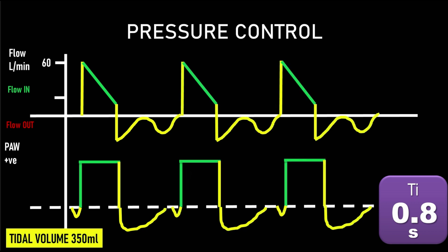What you notice is wrong with this picture. There are two things wrong with this picture. The first thing is you can see that there is a W-shaped expiratory flow curve. Normally that just goes up like a V, but here it is a W. It goes down, it goes up, it goes down again. The other thing to keep in mind is that the flow waveform has shaved off before it has arrived at the baseline. So you have two issues.